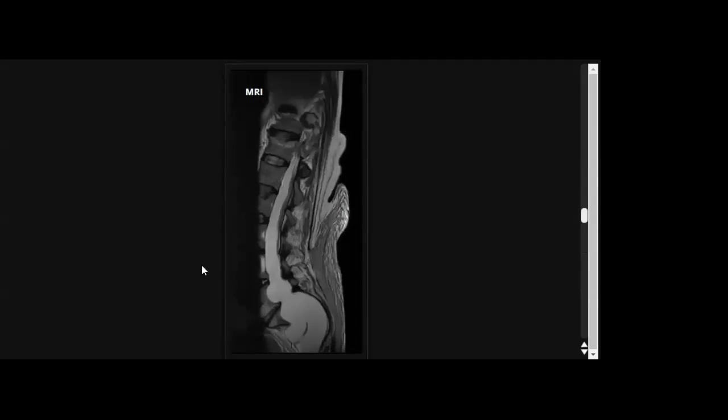I'm looking at T1. I'll give you T1. Just release the mouse, please. Okay, sorry. No problem.